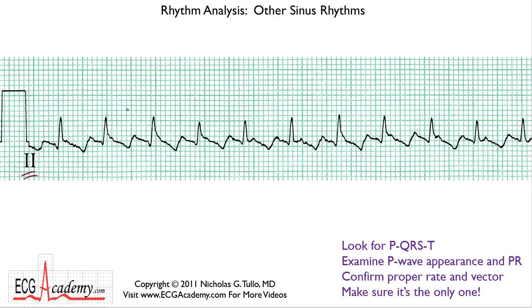So here again we have a situation where the QRS complexes are easy to see. They look to be fairly regular. They march on through. And where's the rate? Let's find a QRS that lands close to a heavy line, right about here. And we'll measure off 300, and it would be 150 if it's here, but it's faster than that, isn't it? It's less than 2 big boxes. It's probably about 152 beats per minute. So we're talking about 152 beats per minute.